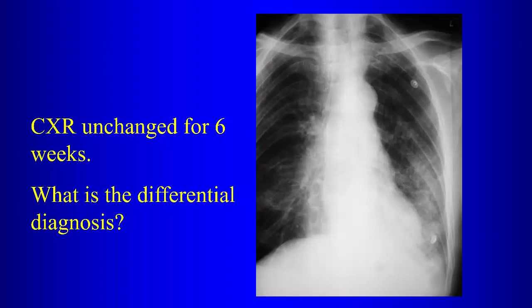So you're reading this chest radiograph. What are you going to say? What are you going to call that? You're reading a chest X-ray from the ER and you see that, you're going to say get a CT? Okay. What are you going to say? I always check Epic, check the white counts, check the fever, pneumonia.